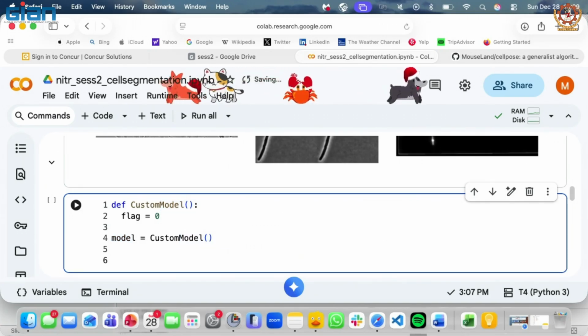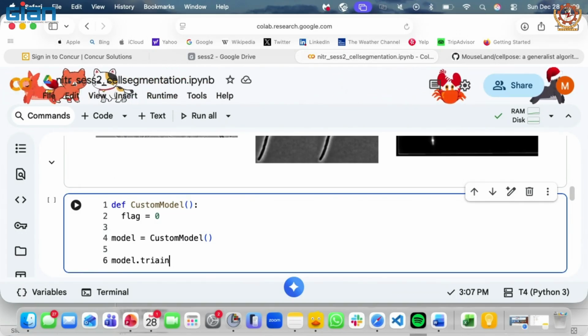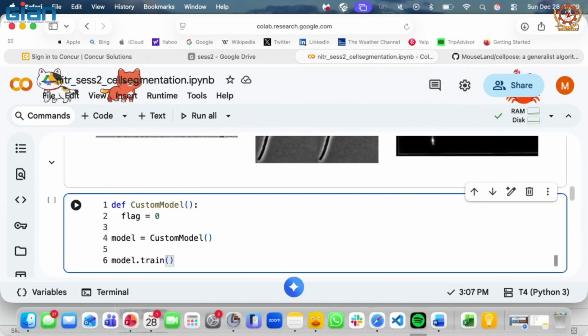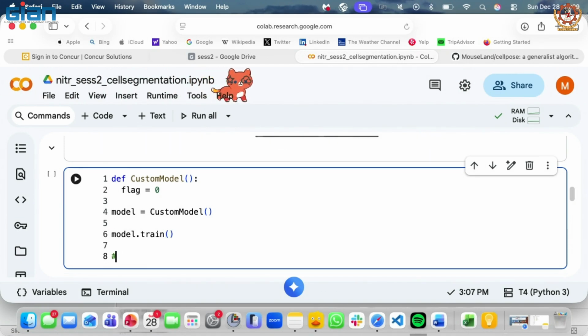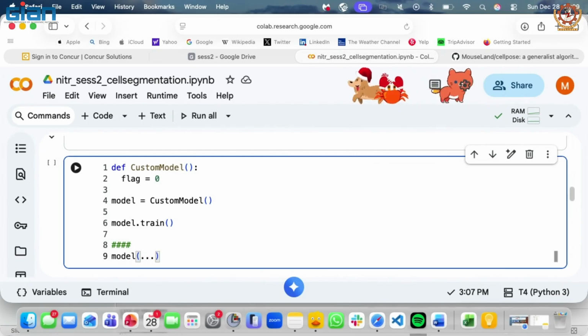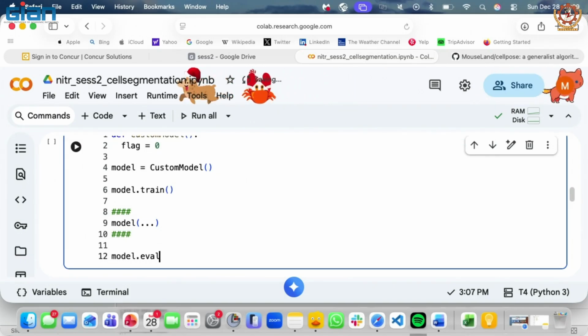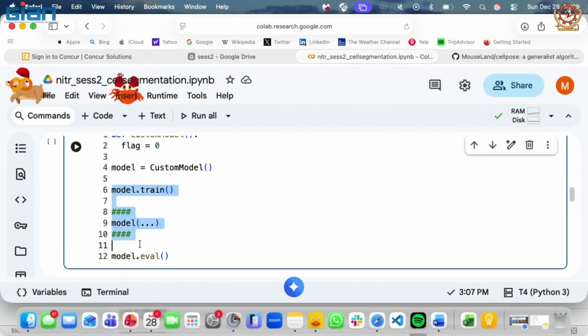Now in deep learning code, if you write model.train in PyTorch specifically, this means whatever happens after this step, whatever happens after step 6 till step 12, whatever you are doing with the model, it is getting trained.